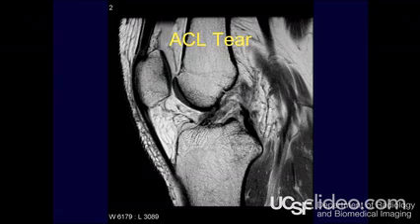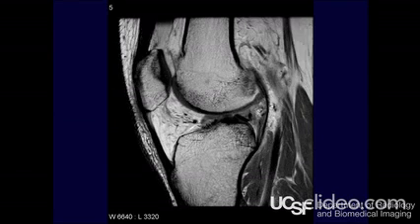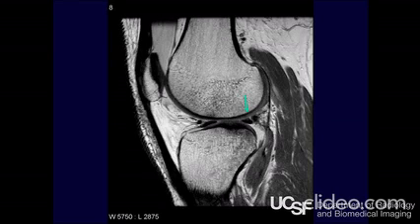So here's an ACL tear, and we're going to see something else now. And as we go from the notch laterally, we see our meniscofemoral ligament attaching to the posterior horn of the lateral meniscus. And we should see that, as you can get a pseudo tear from that. But should it keep going? No. This is many cuts in going peripherally. Too much, there's a tear there.